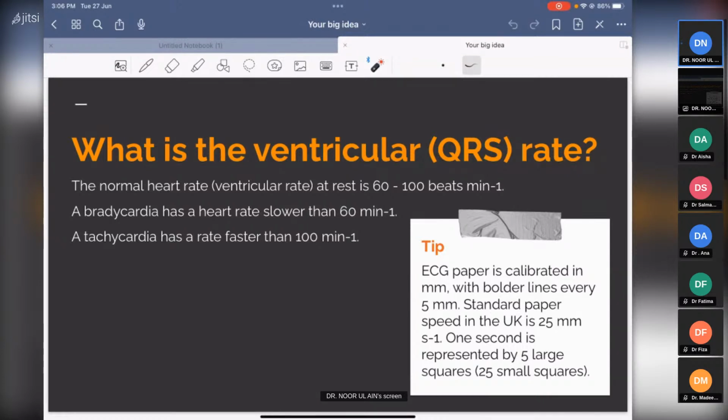Ventricular rate is between 60 to 100, perfect. You move on to question number 3, right? But in the second question, if you see that somebody has a heart rate less than 60, this is a bradyarrhythmia and this is another huge chunk we need to talk about. Or this is a tachyarrhythmia and there is so much you need to speak to. I need to speak to you about tachyarrhythmias.